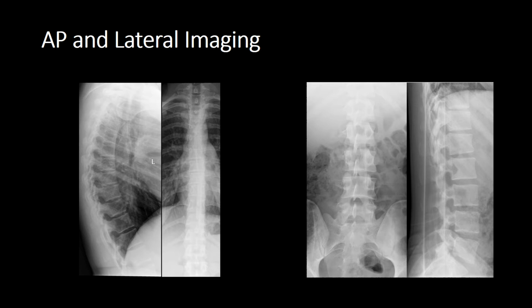Now we frequently get lumbarization or sacralization. Lumbarization is when S1 turns into the appearance of a lumbar vertebra, and sacralization is when L5 turns into a sacral vertebra. So what I want you to get into the habit of doing is identifying L1 and then counting down 1, 2, 3, 4, 5.